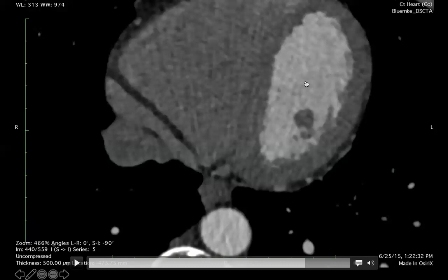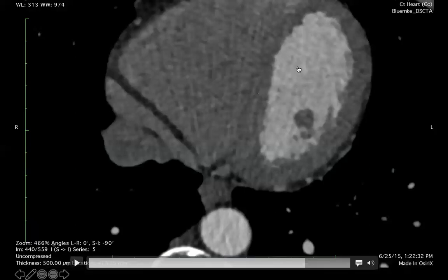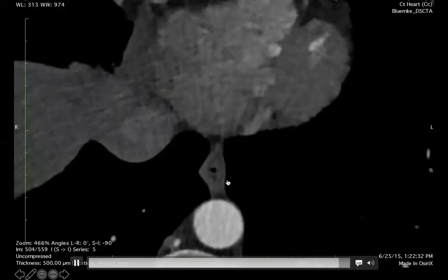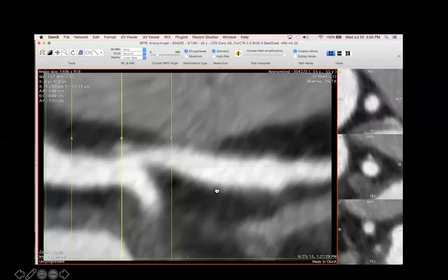The noise in CT has this kind of snake-like appearance to it. It's quite correlated. It's not white noise on top of this image. With the convolution back projection algorithm, we're getting these long correlated noisy streaks. However, again, the spatial resolution for these little small objects on the heart surface is quite impressive.